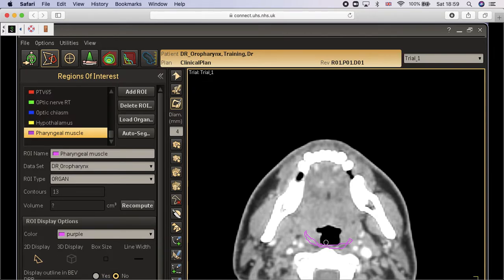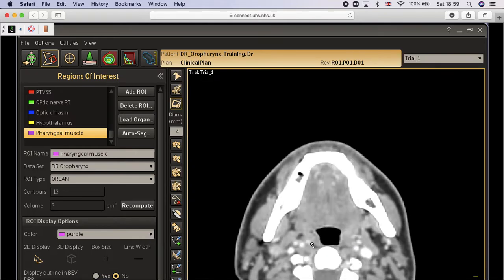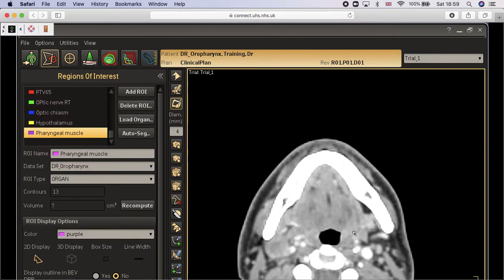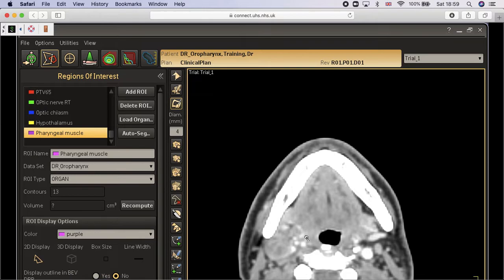Okay. And you go down, you can see the pharyngeal muscle on either side of the tongue, plate shape if you want to stick to that. If you don't, you can see the base of the tongue is coming, so it will be a narrower, smaller part, which will be the pharyngeal muscle. And you go down till the cervical vertebra C3 if you want.